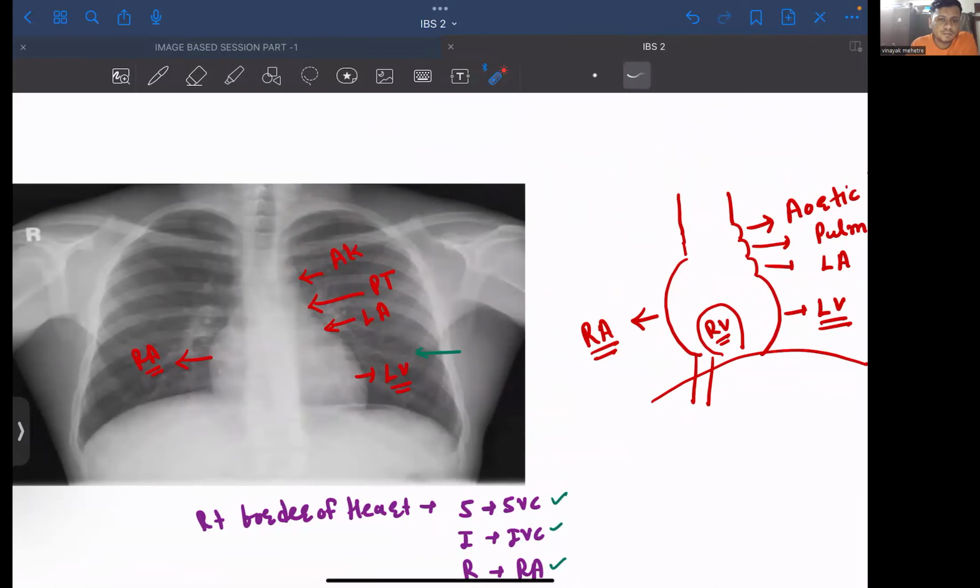How will you remember? The rib which you are seeing... Okay, now there is confusion, isn't there? The biggest rib which is seen first is actually the second rib. So look here: from where will you count? First, second, third, fourth. 4 plus 1. So actually it was the fifth rib. Right? The confusion is cleared. This question has been asked in your exam hall. Right?